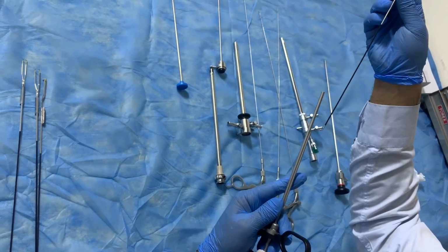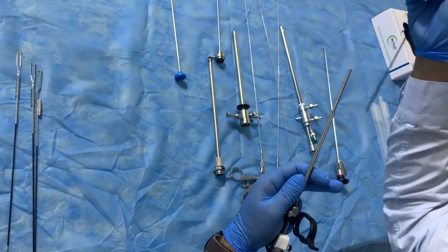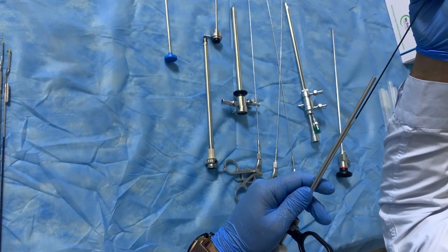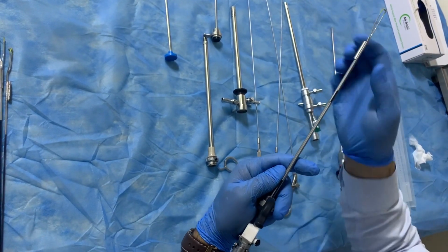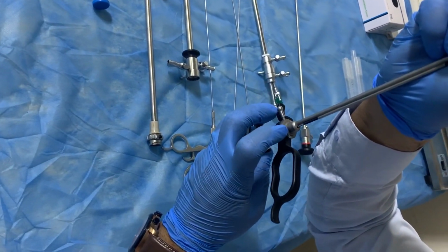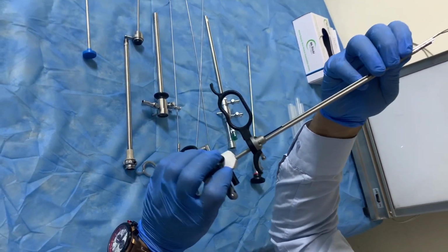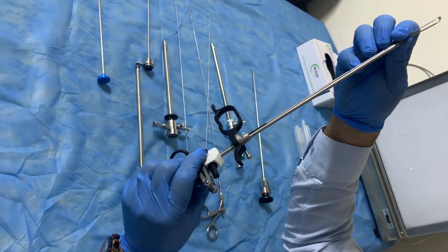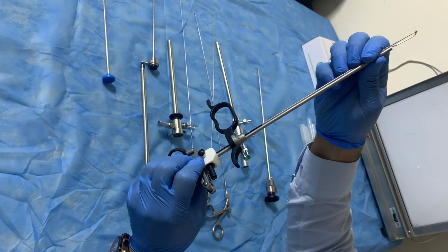There is two channels. One channel in the telescope and another channel in the electrode itself. This it passes in this channel slowly. Look here. Focusing here. There is another orifice here. We push inside of it. Now looking here. And now there is button. Should be press on this button. Press on this button to be fixed. Now it is fixed. Now it is ready.